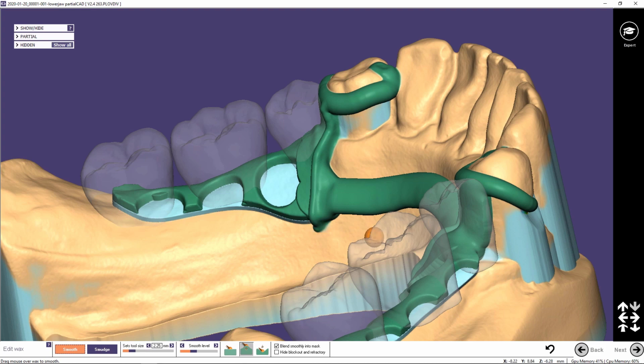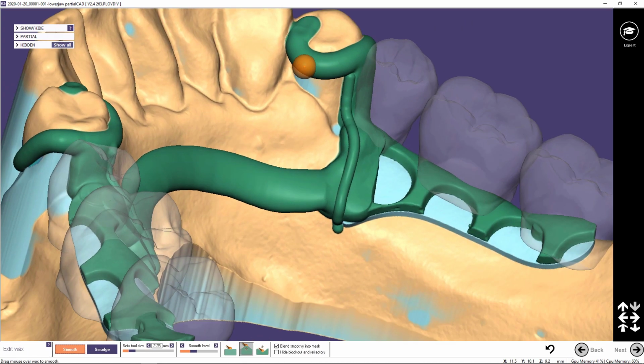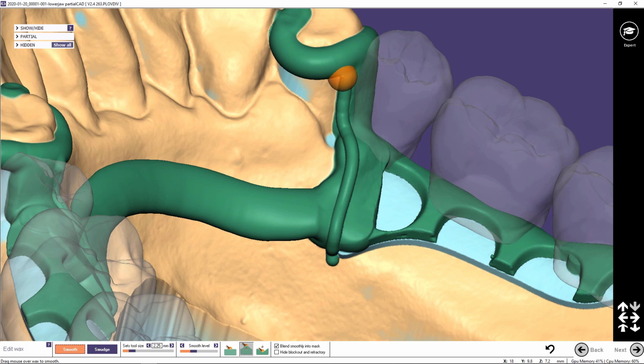There's pros and cons about both ways of applying a finish line, the one step in the wizard or this way. Since this way resembles the traditional manual way more closely, for manual dental technicians it's easier to understand what they're doing here and what they want to achieve.